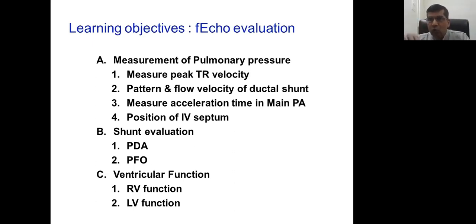Then we have the crude markers, which tell you this could be moderate or this could be severe. We don't have numbers, and these markers have correlated previously with the cath lab markers. Those are pulmonary artery acceleration time, pulmonary artery acceleration time versus RVET ratio, septal position, LV shape, and LV eccentricity index.